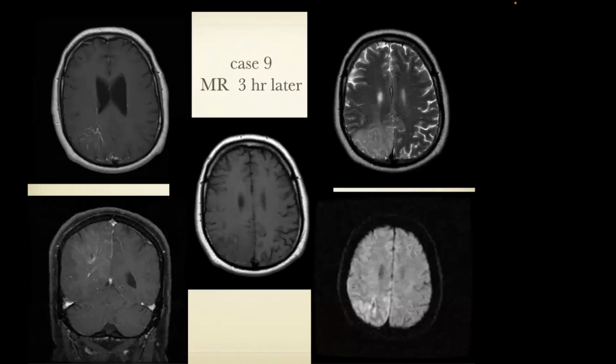The other thing I want to point out about it is this property of venous hypertension. What you're seeing here is edema caused by venous hypertension. This is not an infarct because we don't have restricted diffusion. So this is probably increased extracellular water from the high pressure caused by the impaired venous drainage.